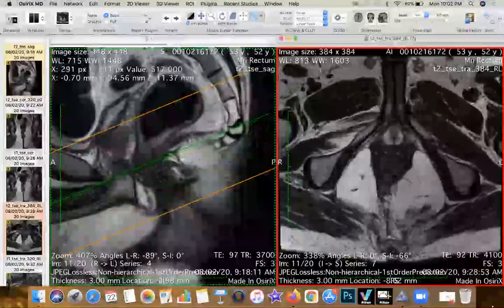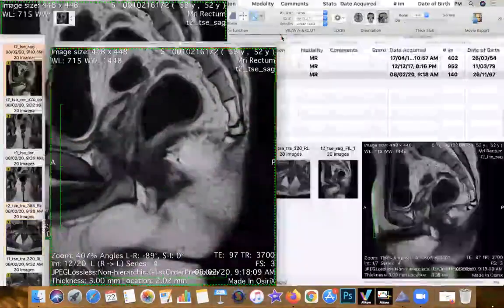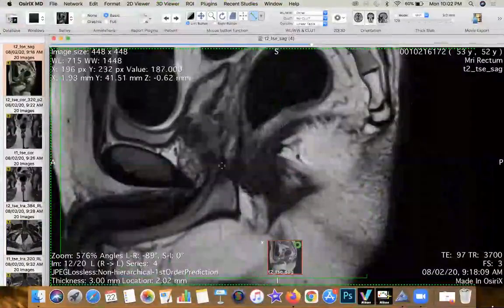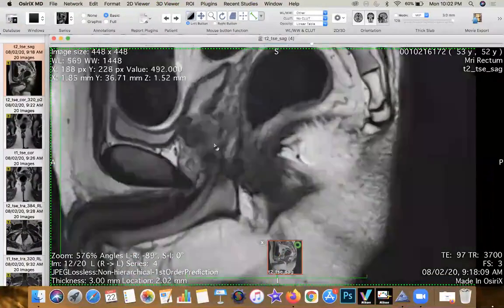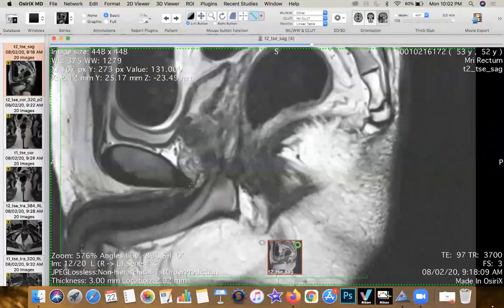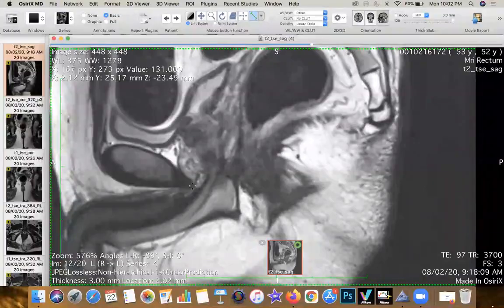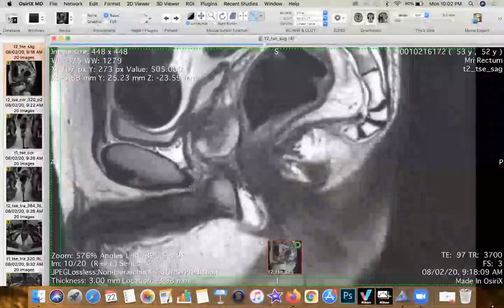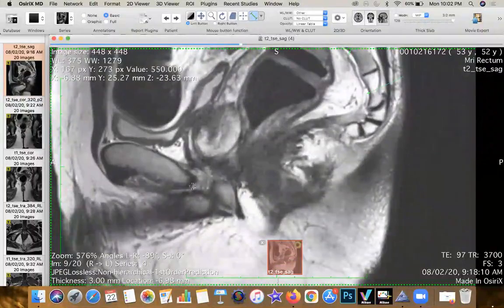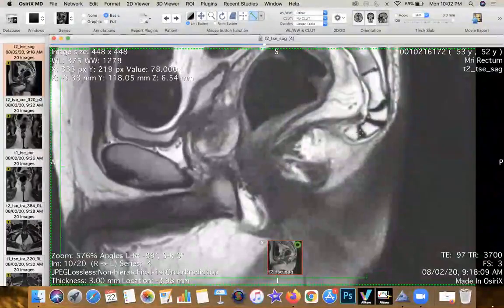Reach up there, get your sagittal, get it bang on the center. Once you're done with that, take out the axial and identify the inferior cortex of the pubic symphysis or the parasymphysis region. You start your line at that location. So that is the anterior-most aspect of a pubococcygeal line. And then what you need to do is look for the last coccygeal joint. What we call the last coccygeal joint is typically seen here.